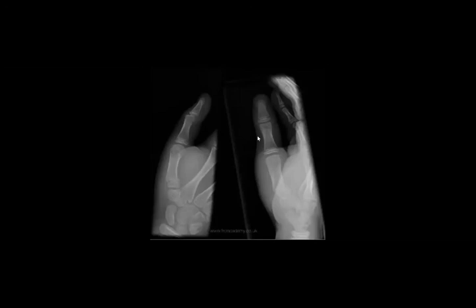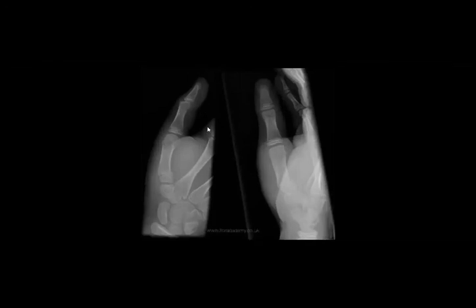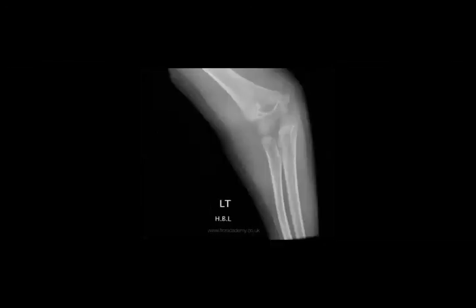One of the most common sites of fractures will be here. It will be the bases of the metacarpals. So look carefully at the metacarpals and look at the bases. So which base here is affected? First metacarpal. Yes, Ala and Irmeen, thank you. Yes, first. Now Marwa.